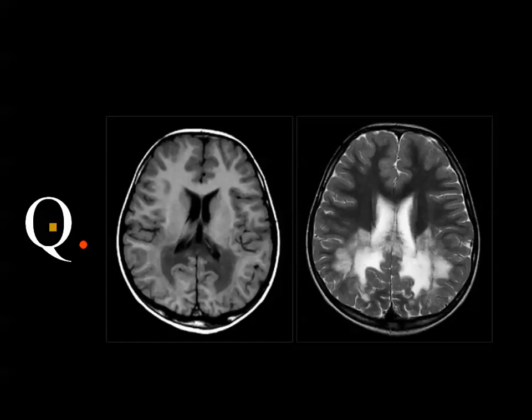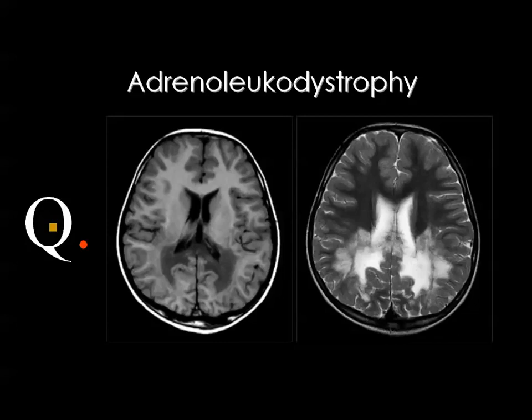The exam is axial MRI of the brain, T1 and T2 weighted images. Okay. Yes, and this is adrenoleukodystrophy. There is abnormal white matter signal, especially located around the trigone of the lateral ventricles and in the occipital area, bilateral and symmetric, low signal in the T1, high signal in the T2, and if you inject contrast material, it will show marginal enhancement, and this is diagnostic of adrenoleukodystrophy.